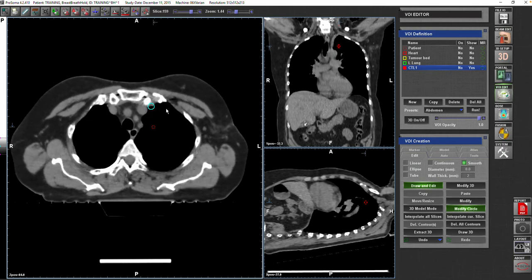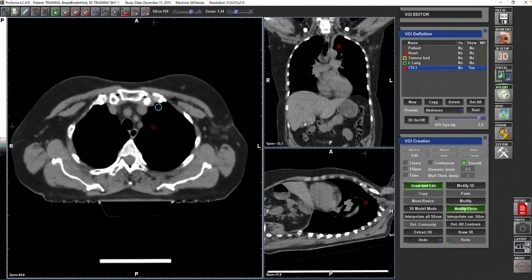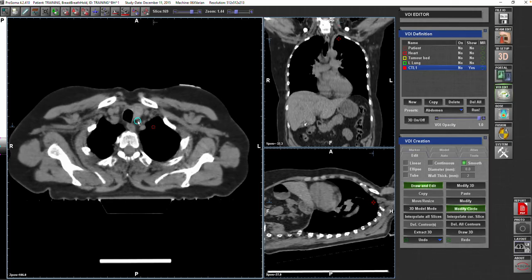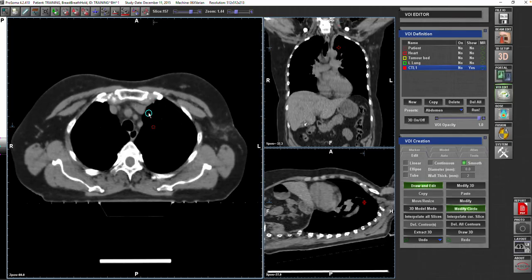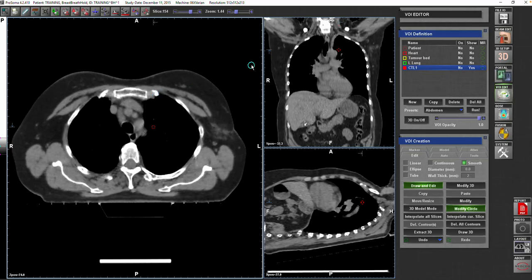So the two dots will end up as one dot, which means that the artery is continuing while the vein is not, because the internal mammary artery is coming from a higher point compared to the vein, which left the artery to join the innominate. Do you understand what I'm saying?